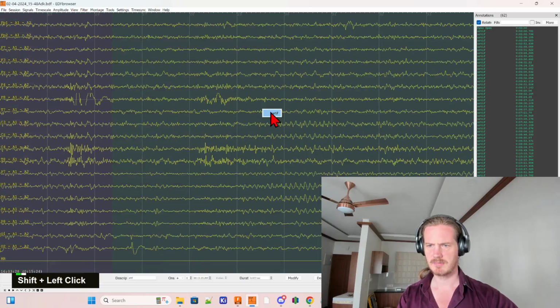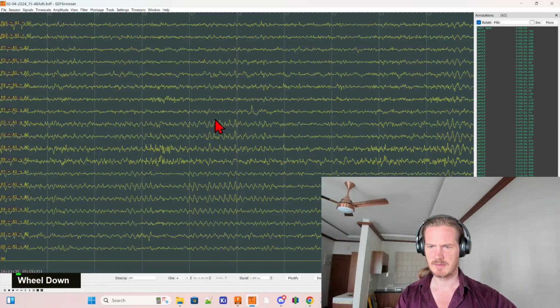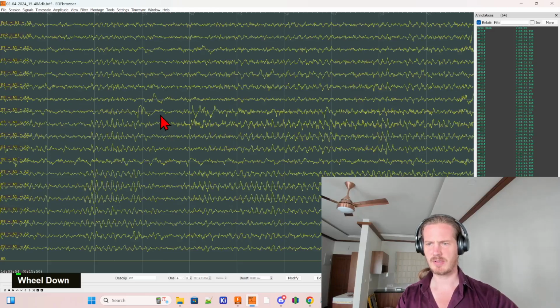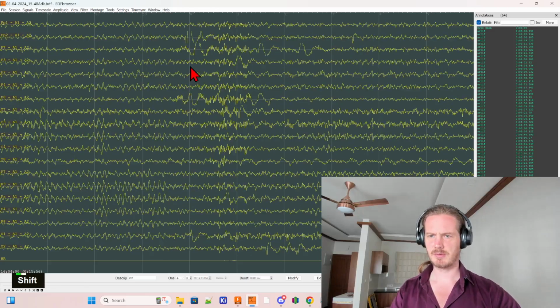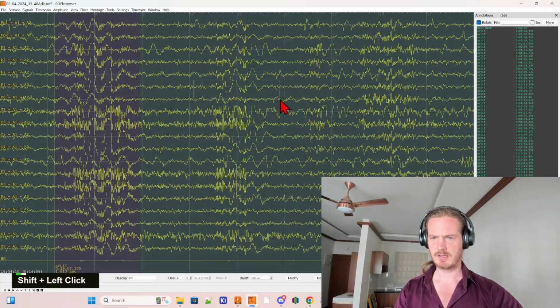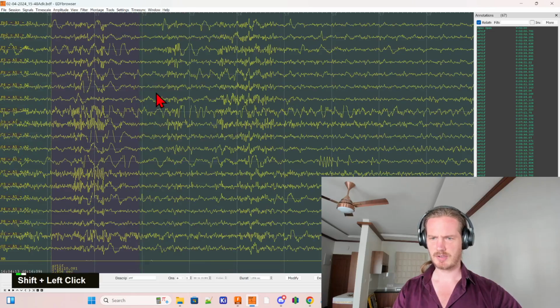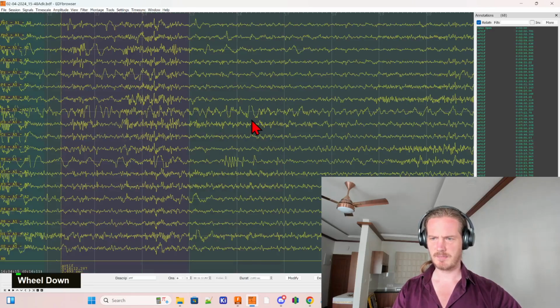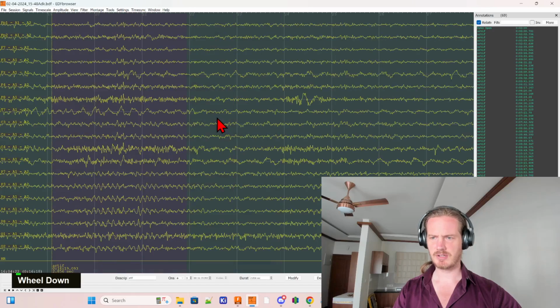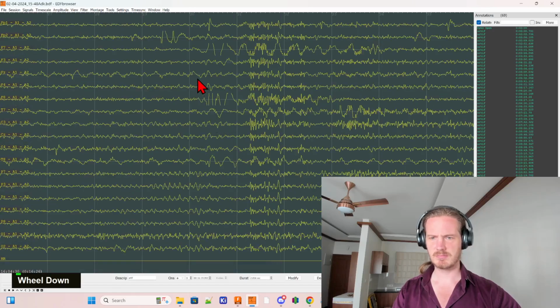And here. And here. This is a little bit, but I'm going to leave this as it is. It doesn't quite meet my threshold. This is definitely going away. And this is going away. And this is going. I would say this person either moved around a lot or has a stiff neck. There's another recording I made recently, and that person just had a continuously stiff neck, and I had to dismiss the whole recording.